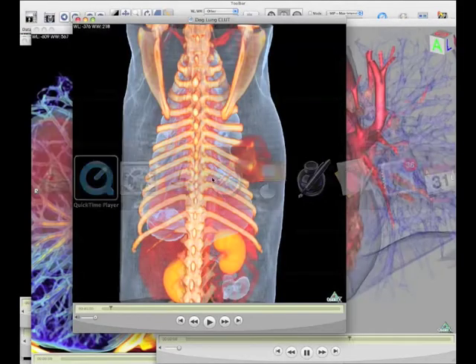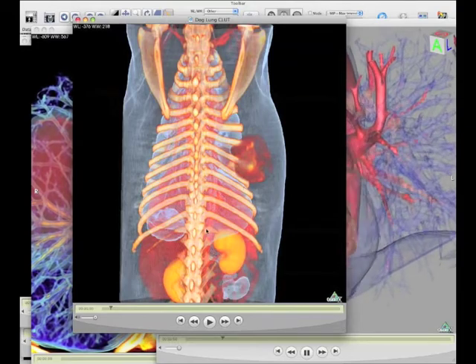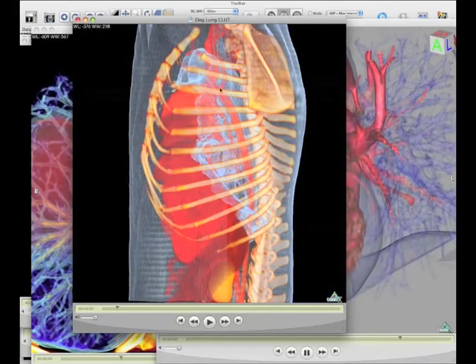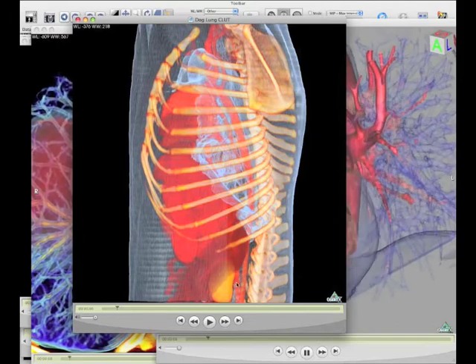And we're also going to assign transparencies to them, so the muscle in here has been made very transparent. Right, and it takes a little bit of practice, but it's very, very useful. Here we can see the dog's heart, dog's aorta, the great vessels. The blue is the lung. This is liver, kidneys, obviously.